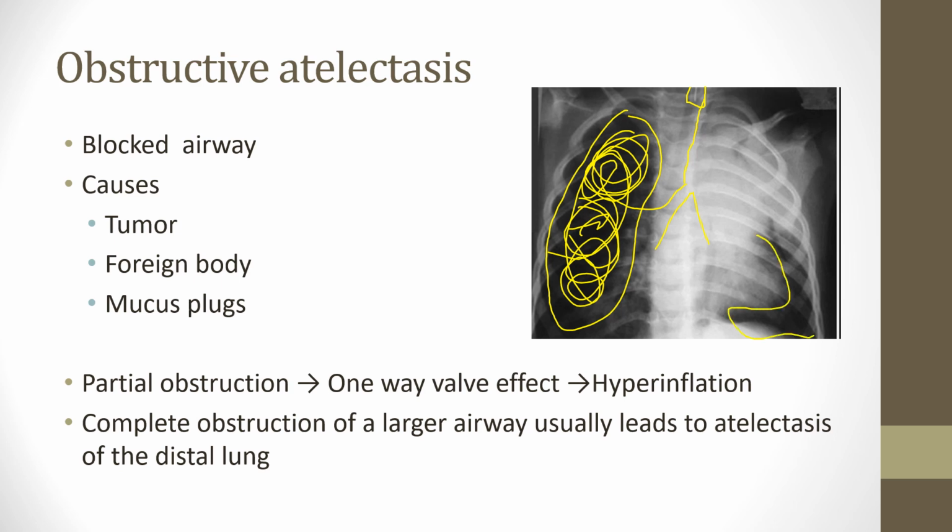You can see, right, this whole area is that hyperinflation distal. That air cannot get out of there. It's trapped. And so everything proximal is consolidated, right? So this whole area here, all this stuff is just consolidated tissue. So we have a massive mucus plugging that's trapping gas into that left lower area and just consolidating that whole rest of the area while this patient continues to get a ventilator-induced lung injury. Oh, this is not good. All right, so hopefully this is starting to come together for you.